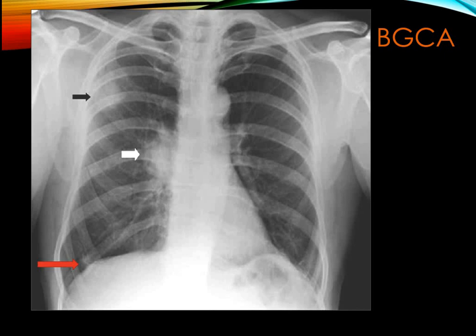As for the consolidations, they could be secondary features in metastasis, or they could be secondary features here. In this chest X-ray the key finding is unilateral hilar enlargement with spiculations. It can come with a patch, a nodule, a mass, pleural effusion, diaphragmatic elevation, mediastinal lymphadenopathy, right paratracheal lymphadenopathy, whatever. The key finding is the spiculated hilum.